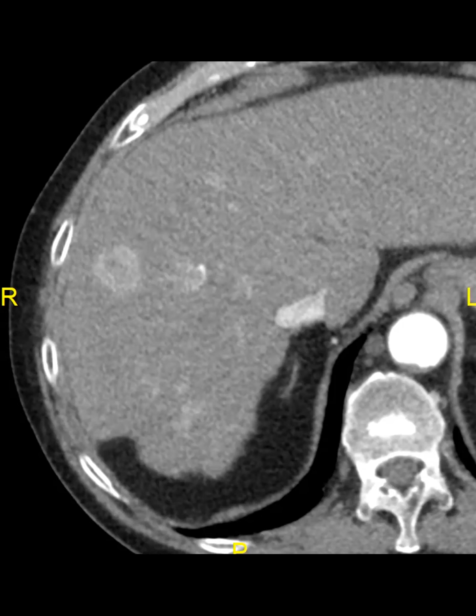Okay. And then can you explain to me and everyone the rim? My understanding is that's because cholangios have more viable cells along the periphery and central fibrosis? Correct. Classic cholangios will have a very cellular periphery and a very fibrous core in the center.